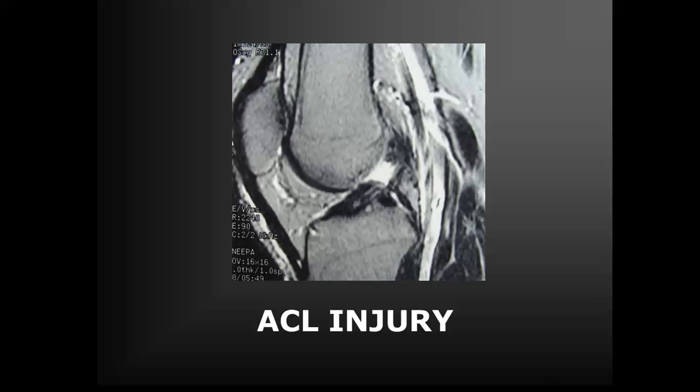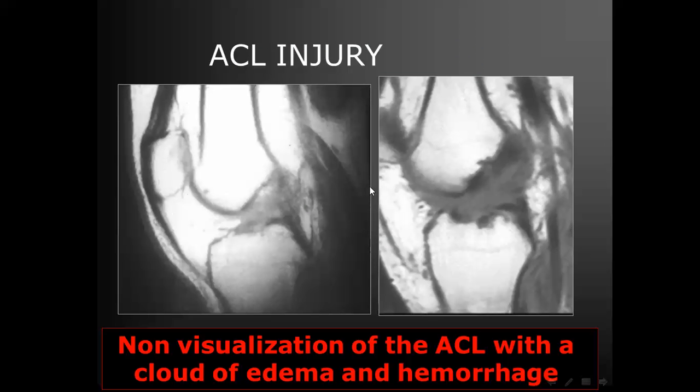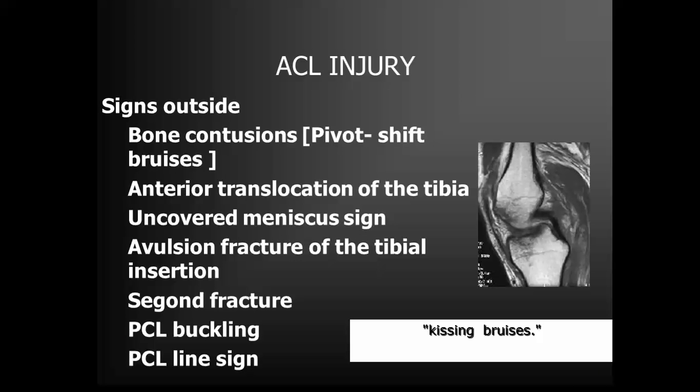ACL injury, complete injury. Non-visualization of the ACL with a fuzzy appearance, cloudy edema, and hemorrhage. This is ACL injury. And here we have ACL injury with kissing bruises.